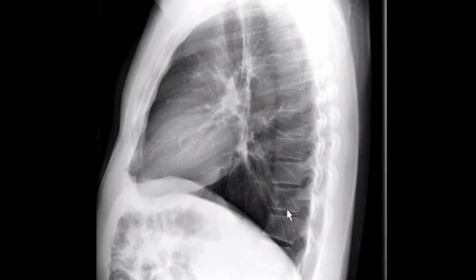So how I approach the lateral view is I usually just take an overall outline of the lateral lung view, and I look at my costophrenic angles down here to make sure there's no layering fluid, which would mean there's a pleural effusion. I follow my right hemidiaphragm up, followed by my left hemidiaphragm. Take a look at the overall view of the cardiac silhouette. I should see a nice retrosternal clear space, which I do. I follow my lateral view of the trachea down and esophagus if you can see it. And I take a look at my hilar region as well.